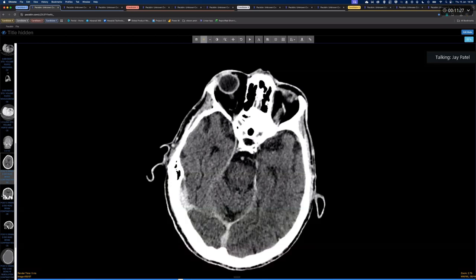What other investigation might follow this apart from an MRI? You mentioned one of your differentials was metastases. What else might you do in that scenario? Okay, when I'm suspecting metastasis, then I should be looking at the bone window to complete the study, looking for any bone lesions.